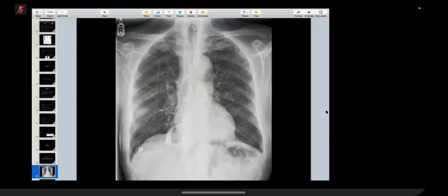Okay. So this is a frontal radiograph for an adult patient. I can't clearly see the NG tube that's been inserted, but just looking at the lungs, there's no focal consolidation or collapse. There is an abnormality in the sort of right lower zone, which looks like possibly the gastric bubble. This would be in keeping with a previous esophagectomy if it had been pulled up.